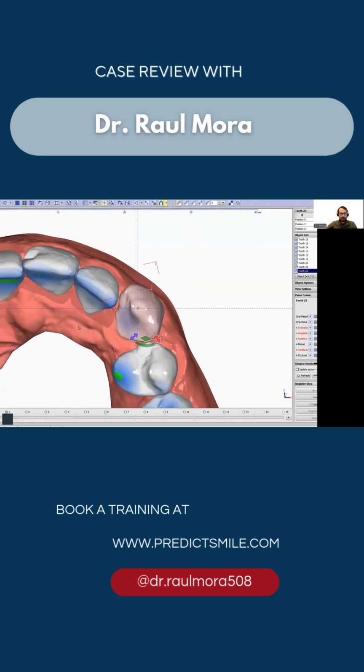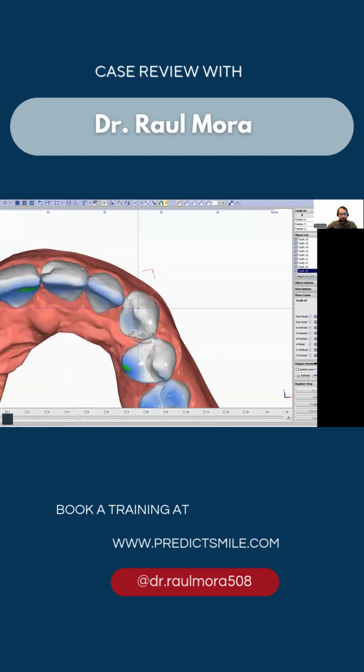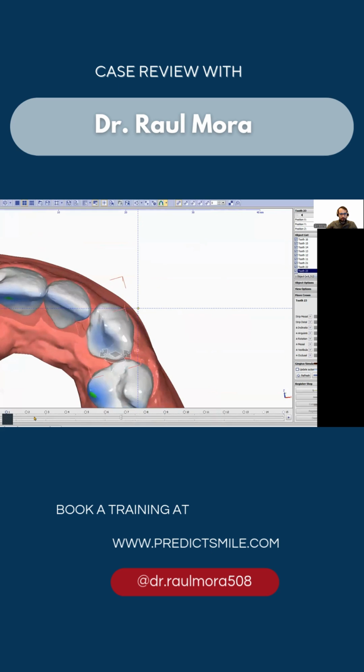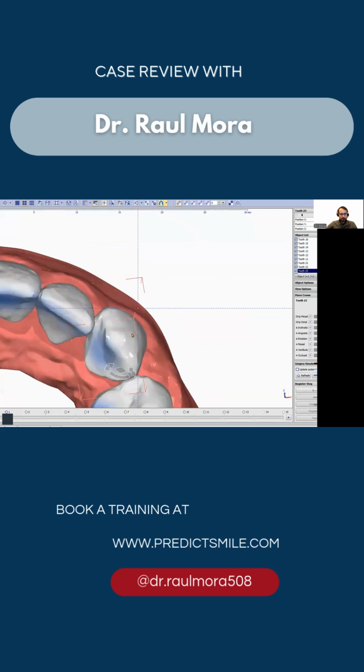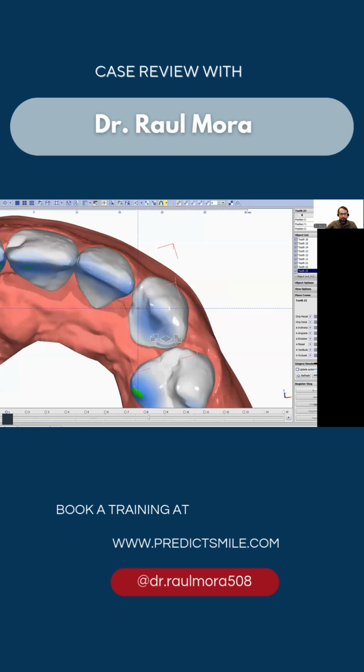So let's just create some space. Then we go in the staging panel just to fix what I just did, and avoid the red collisions, because remember, we don't want the tooth to go far away from our limitations. Be sure you have room to do these movements usually. If you think you're reclining and moving forward too much, decrease the forward movement. But this is how you should be doing your staging. Distal out movement and then mesial in. This will be more predictable and easier for the aligner, you can see.